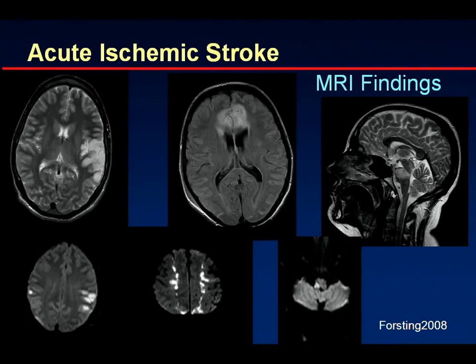This is a really tragic case of an infarct, again on a T2-weighted image in the region of the brainstem, pons area, and this patient is locked in. So basically, there's no way that we know what he's thinking or doing. He can't do anything.